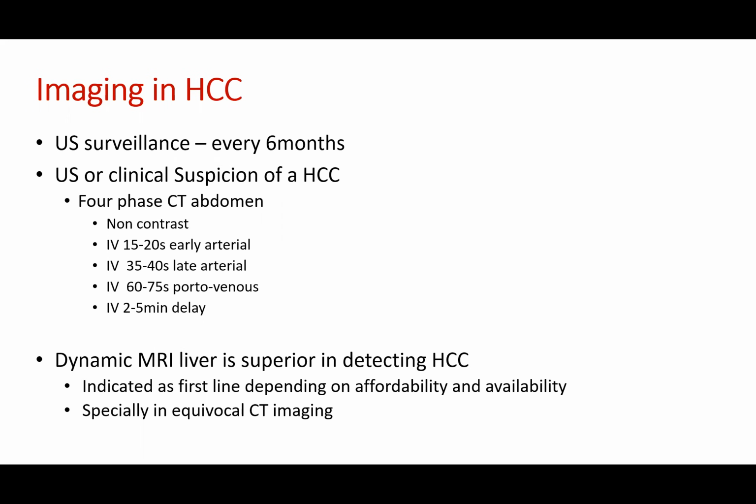So therefore, I suppose we might have to consider CT for the surveillance if there's high clinical suspicion. What do you think, Eranda?